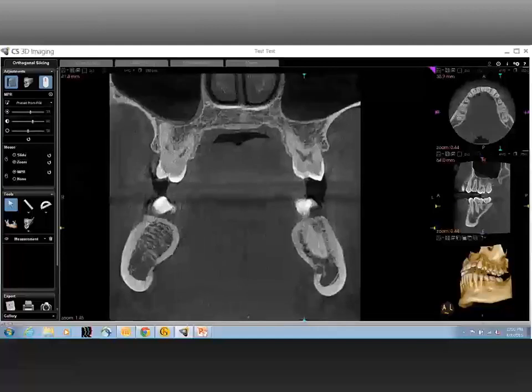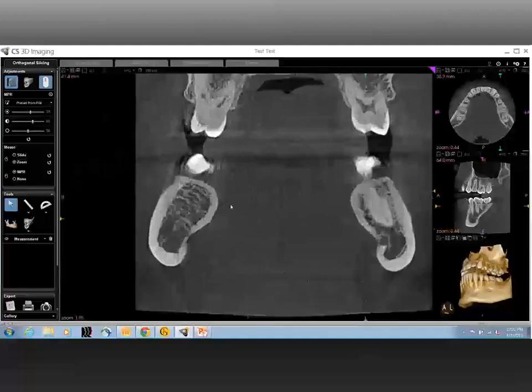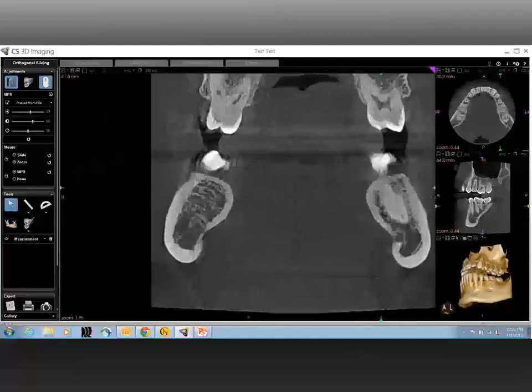Since the traditional way of examining bone density cannot be applied to CBCT, it is imperative to go through all these three different types of, for lack of better words, types of bone or different parts of bone, to understand a certain pattern in how the bone could look different from one side to another or between two different individuals.